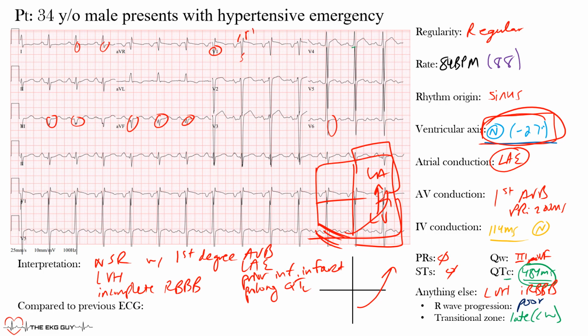He actually had a prior EKG that showed normal sinus rhythm. That was it. Okay, so these are very big changes. A young male coming in with hypertensive emergency, was actually refractory to a lot of medications, and has a lot of changes that we're seeing, and likely a consequence of uncontrolled hypertension. Very non-compliant with medications, and that has brought him in with this.